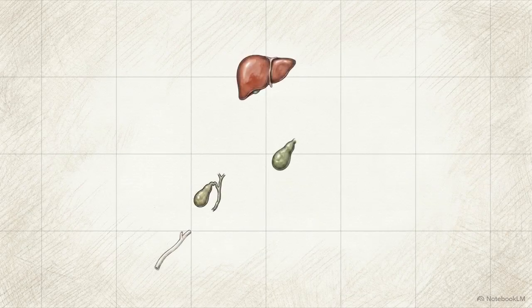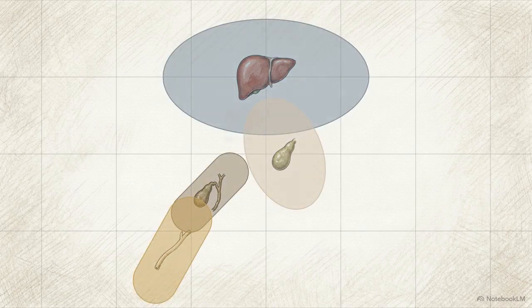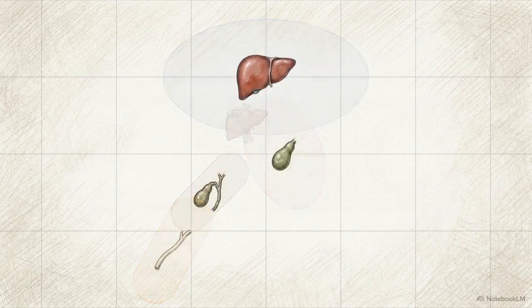Automating this validation starts with spatial perception. Models like U-Net process the incoming video to generate precise semantic segmentation masks, explicitly defining those required anatomical zones. But colored pixels alone cannot confirm safety. Engineers convert those spatial masks into a semantic graph structure using a graph neural network. Nodes represent the centroid of each structure, and the edges calculate the exact geometric distance between them.